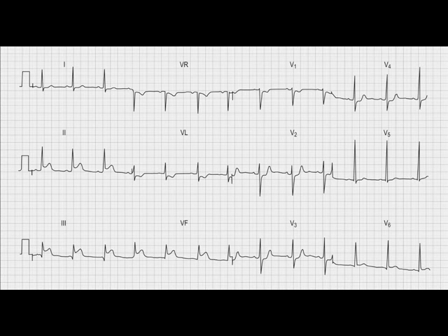Look at the QRS complex. I'm particularly looking at V4 and V5 and the shape and the width. It's certainly a nice shape, nice and sharp, and it's no wider than 3 small squares at its widest point. It can be on 3 small squares but shouldn't be any wider, so that's normal. This is not indicating there is conduction problems in the ventricle.